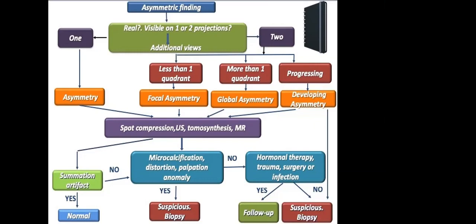There is one of these asymmetries from the beginning, regardless, and I have to raise the suspicion until proven not a suspicious finding, which is the developing asymmetry.